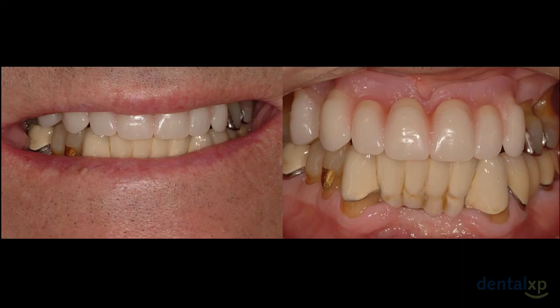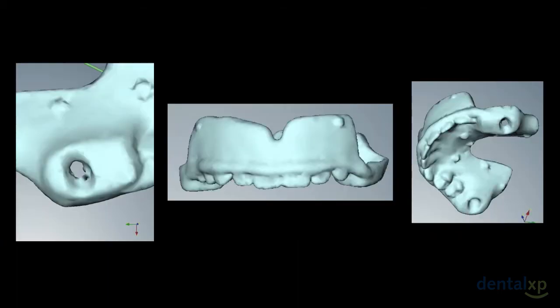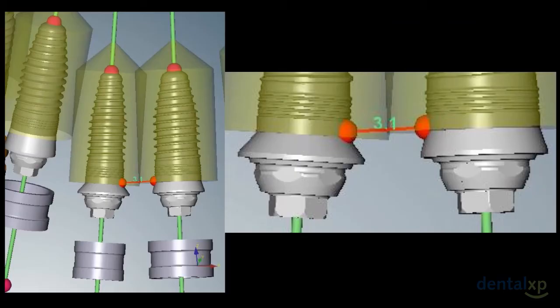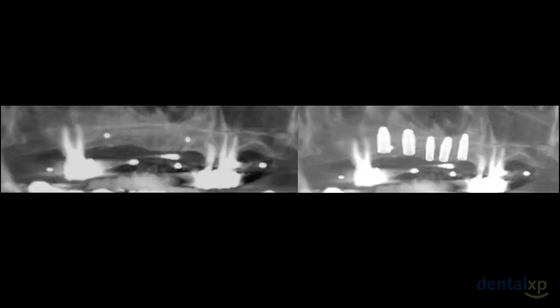Here's our diagnostic wax up on the patient, understanding tooth positions of where we want to have the implants placed, and scanning that data into our software. Using three-dimensional scans, here's our radiographic template and the proposed implant positions, understanding how much space we need per implant, and in the three-dimensional realm, understanding where we're going to place those implants. Traditional implant healing was used in a two-step approach.